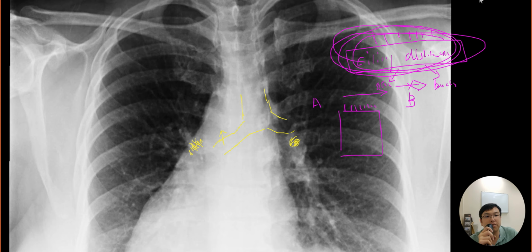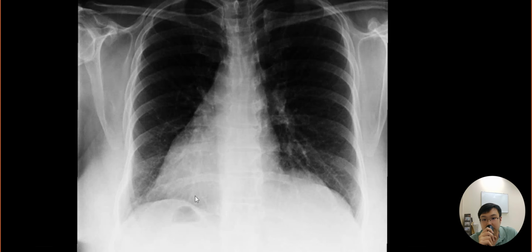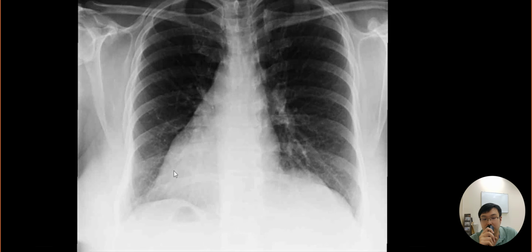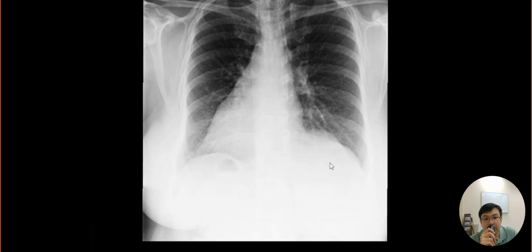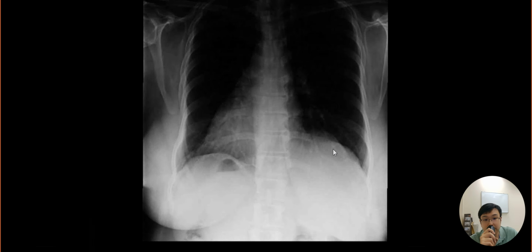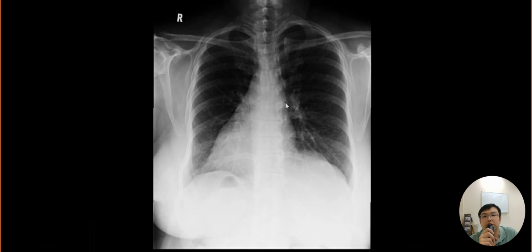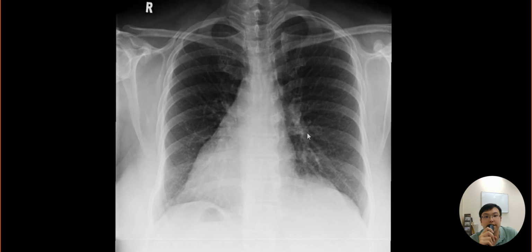So do we see any bronchiectasis? Especially as this patient also has some non-specific cough symptom, but we did not see any, okay? Basically, that's just some normal lung markings on the lower zones. And we try to see through the diaphragm to see the most inferior aspect, which is not abnormal at all, okay? So maybe just some non-specific symptom may not have any lung changes in this patient.